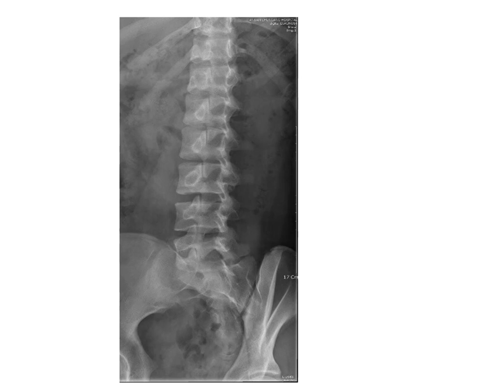So that would mean that the position could only be a posterior oblique. If the X-ray is entering the front of the body and exiting the back, that means they're in a posterior oblique position. So if I tell you this is an AP projection, you need to know right away, oh, that's a posterior oblique position. All right, so now we can look at the ilium to identify the rotation.